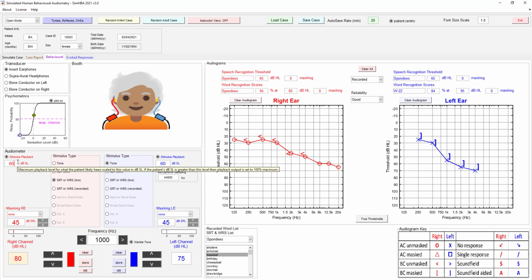When you're presenting the stimuli and you're listening to them, it's the tones that you present out. But when we're doing live recordings, the speech recordings, it's what the patient will likely hear. And this is modeled off of the auditory filters that are set up based on modeling of the hearing system from Glasberg and Moore's research and others. So we can present different stimuli.